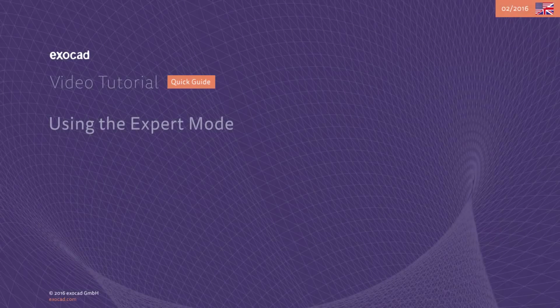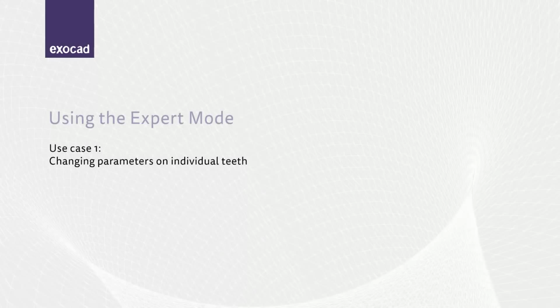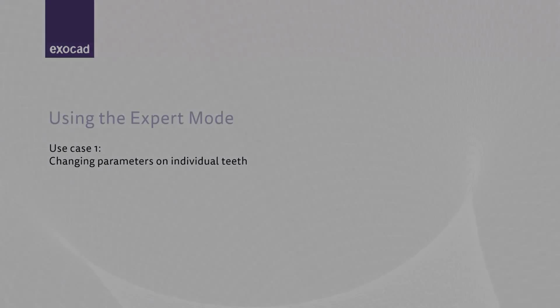This quick guide tutorial from exocad shows on some sample cases how to use the expert mode correctly. The first sample case is changing parameters for individual teeth.